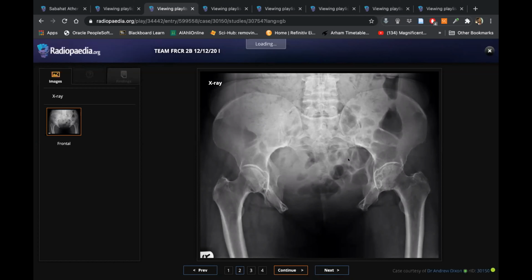Yeah. If I tell you that this is an acute condition, I saw the X-ray of this female patient, 36-year-old, and in her previous X-ray, there was no widening.